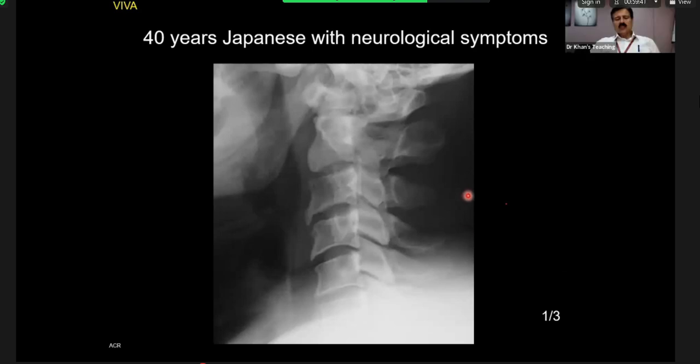And what is the axis of this? Is it longitudinal? Is it horizontal? I cannot give you the mouse right now, but if you can tell me. It's longitudinal. It's perpendicular. Okay, very good. It's perpendicular. So I presume you are picking this up. If you see here, this is the finding, and this is a classical example.